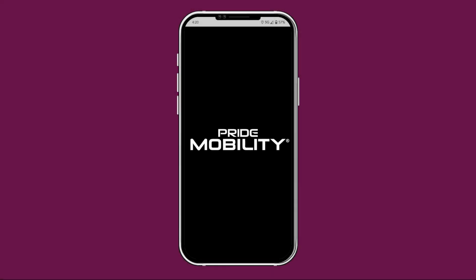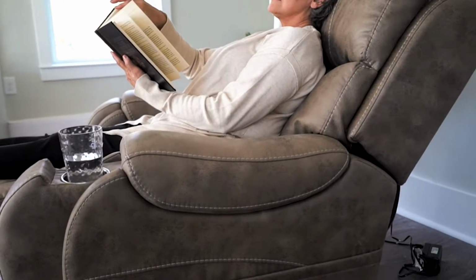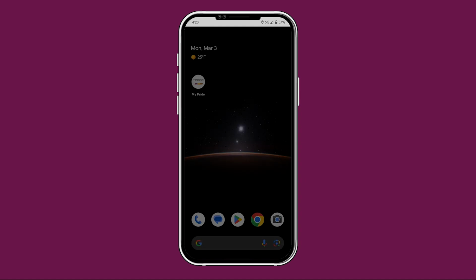Pride Mobility now has a convenient app to offer you even more independence in your everyday life. The My Pride app is full of important information and exciting features to help you get the most out of your mobility experience with our power wheelchairs, electric scooters, and power lift recliners. This video will walk you through creating an account, adding your product, and exploring the different features of the app.